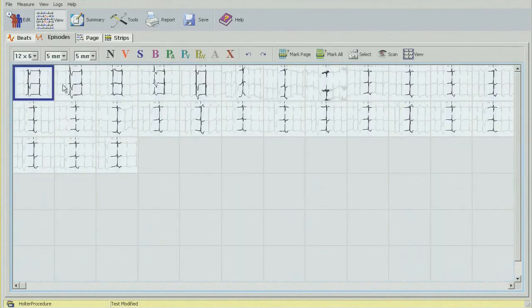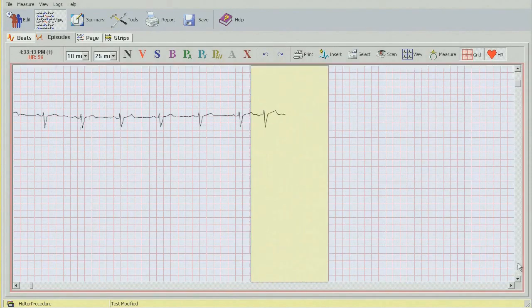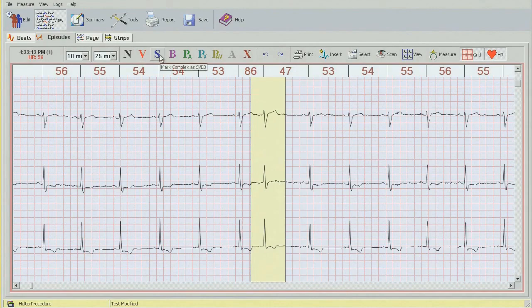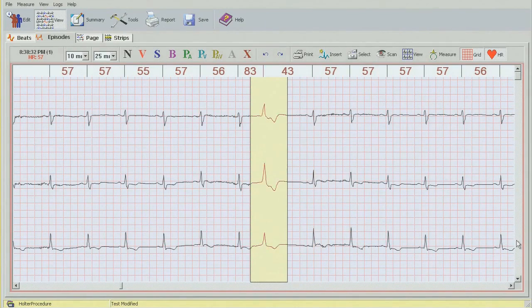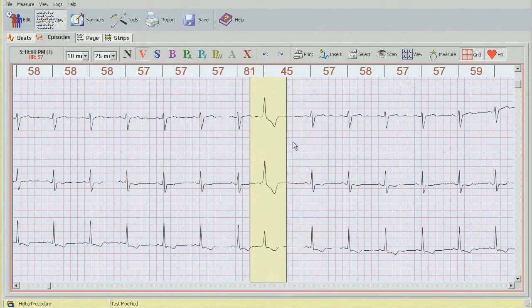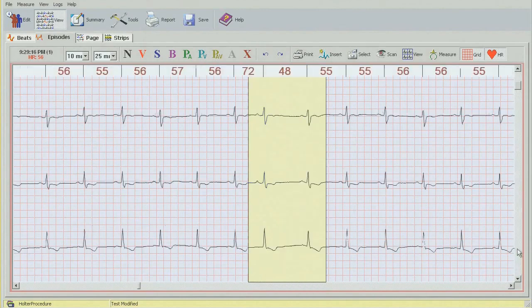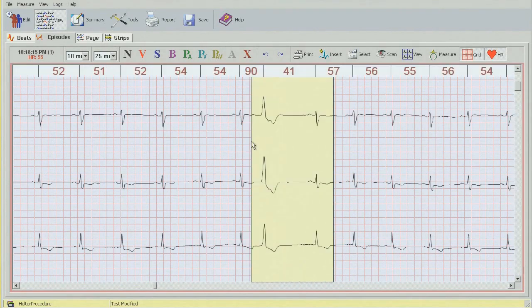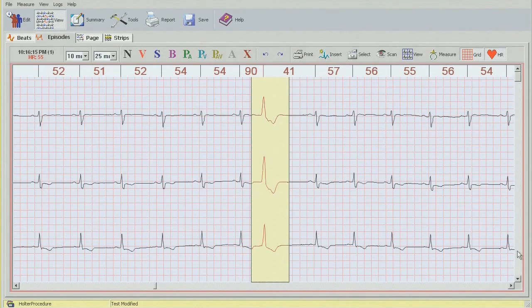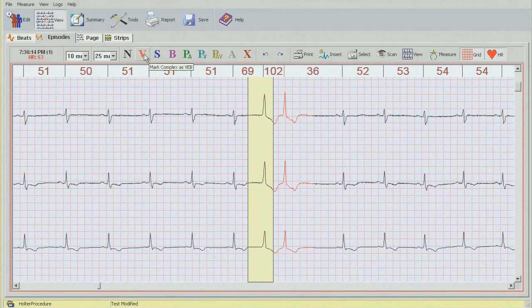And this is where our ventricular beats were hiding, so I'm just going to change them. Click on the first one, change to ventricular, and keep scrolling through. There's an SVB here. And moving on to the rest of them. Supraventricular. There's another ventricular.